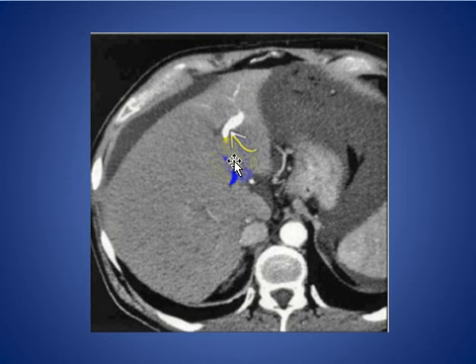Here we see arterio-portal shunt on axial CT scan in the arterial phase, and an abnormal vessel noted on the left lobe of the liver with filling of the left portal vein due to arterio-portal shunting, and this resulted from biopsy, with biopsy resulting in fistula in this patient.